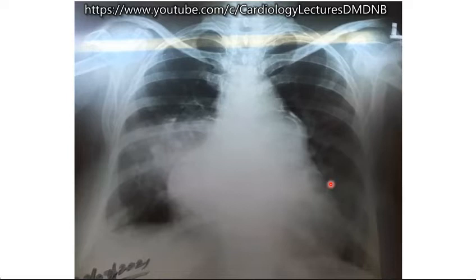What is the explanation for right atrial enlargement? Is the right atrium enlarged in PDA? No, sir. This is LA enlarged only, sir, not RA. No, but I agree that there is some degree of RA enlargement also. LA enlargement is there, with some superimposition of LA and RA enlargement, but I had a feeling that RA also is enlarged. What could be your explanation?